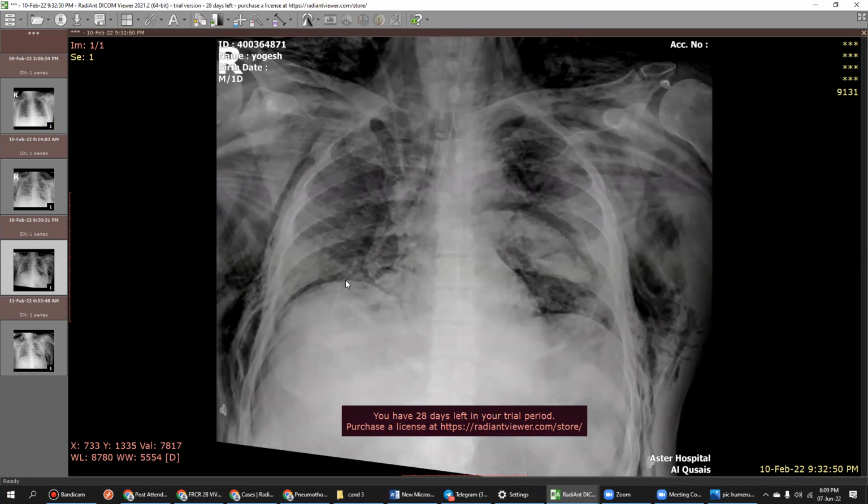I am suspecting the possibility of pneumomediastinum, which is high in these circumstances. Lung fields evaluation is also decreased in the presence of the marked surgical emphysema. I would also note the nasogastric tube in situ. I would convey my findings to the referring physician and correlate with the history of the patient for possible trauma, and recommend enhanced CT for further evaluation of both lungs and the mediastinal vascular structures.